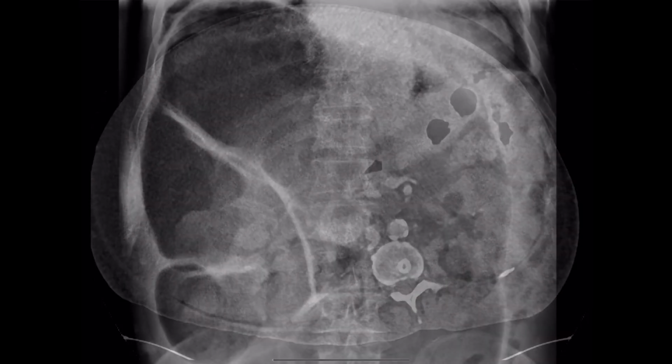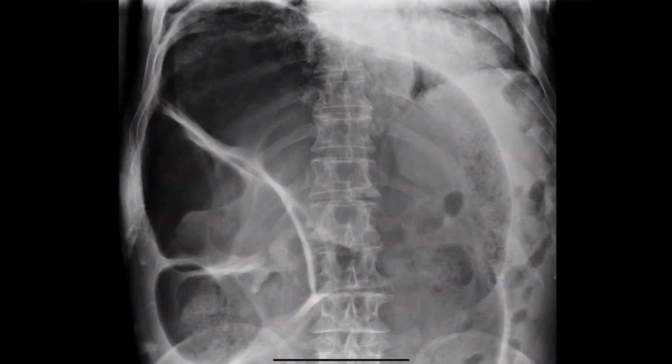Okay, great. Thanks. So here's an interesting plain film, which we also incorporated because it's not uncommon as a surgical presentation. A lot of elderly patients will have this problem as a general rule. One of the first line investigations, if a patient with abdominal distension comes into A&E, is to get an abdominal X-ray. So here we've got an abdominal X-ray. Although we are not quite seeing the pelvis here, we're just seeing the wings of the iliac bones. But we can definitely see that there is an abnormality here.